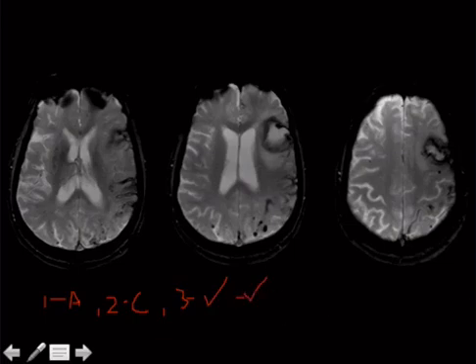Because remember that blood products are like little magnets, the iron, the hemoglobin like little magnets, and that causes local field inhomogeneity, which causes a blooming artifact. So these are your 3. If you see a susceptibility sequence, think it's either an amyloid case, a cavernoma case, or it's this person has a bleed or does not have a bleed case. Those are the 3 reasons to show it.